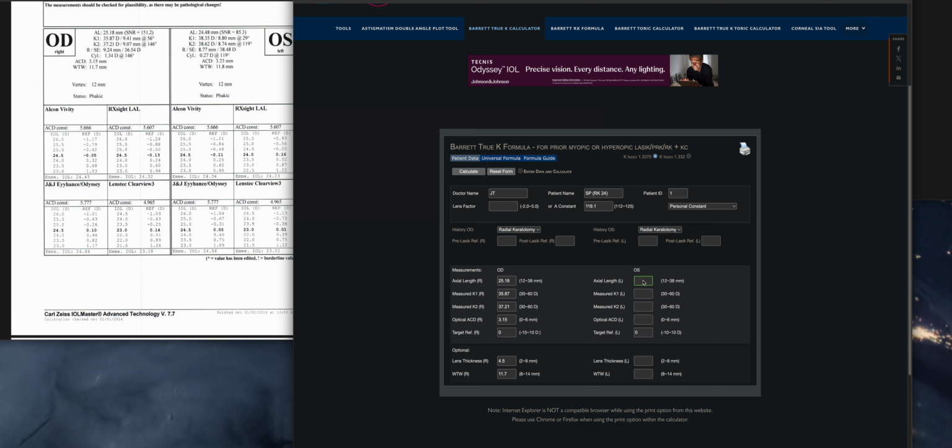And here it's 24.48. K1 38. Interesting. See how the numbers are just so different. 25.2, 24.